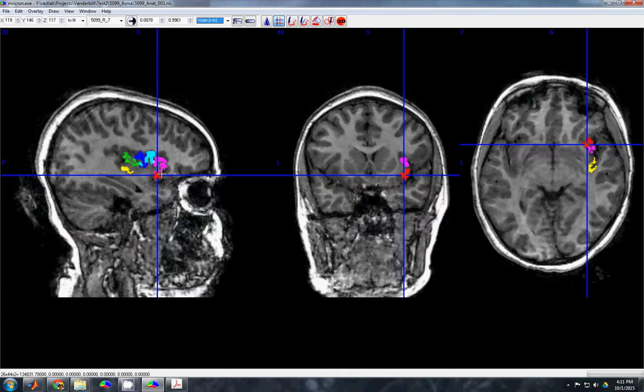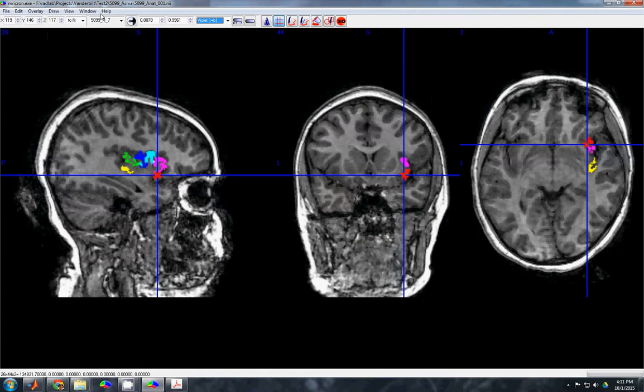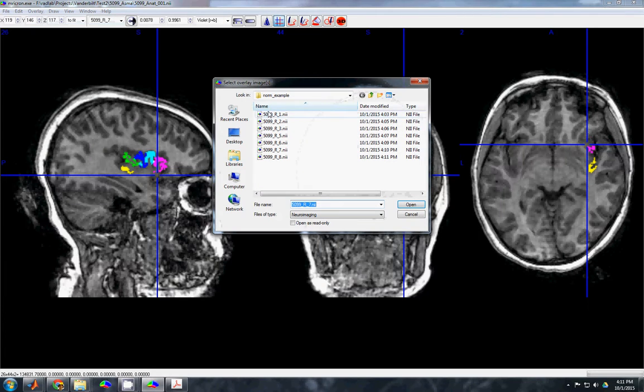So just to finish up number 8 here, I'm going to save this as number 8. And then I can close that, and let me just open them all up. Except I'm not going to open up number 5, because I realize I'd like to put a little more here on number 5. So open the rest of them.